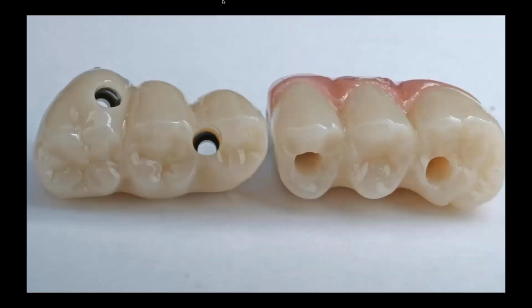Here's another example, and I love this example. This is a case restored by the student clinic at MUSC. This case was done by one of the residents here at MUSC. The bridge on the left side, the implants were placed freehand. The bridge on the right side of your screen, so the patient's left, was done with guided implant surgery. Same patient, different sides of the mouth, totally different philosophy on how implants should be done.